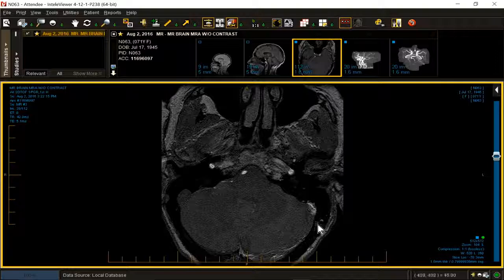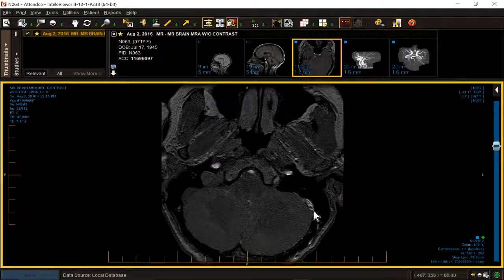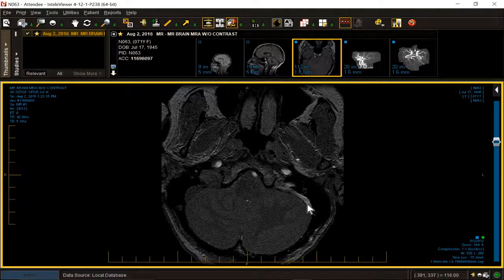However, there are inordinate veins draining this way, retrograde, and there are inordinate veins compared to the other side draining antegrade. So in my personal opinion, there's antegrade flow, there's retrograde flow, it's a mixture, there's some cortical reflux, the vein is distended, and this is a patient with a high risk for a bleed, probably 50% or greater.